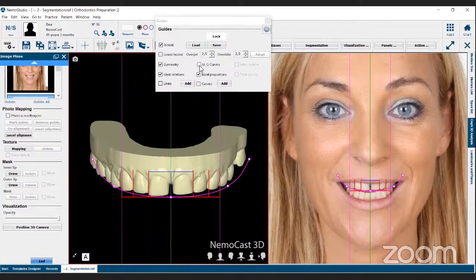And then finally, the MG curves is the papilla, whose use is basically to see the asymmetries that we have between right and left side. And then we do the upper limit, the gingival limit, also until the zenith of the canines. Now, limit is not the best word, like I mentioned before. These are not limits. It would be the gingival guideline.